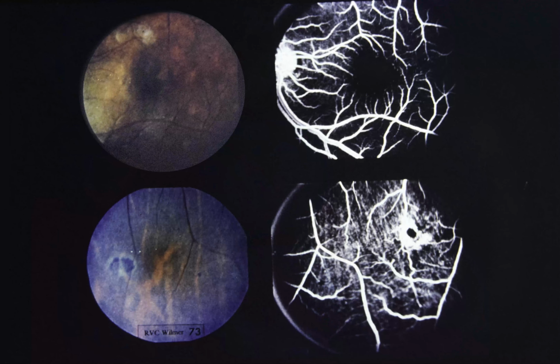Slide 73. Hemoglobin SS and retinal infarction. This 34-year-old black female noted a sudden decrease in vision. Visual acuity left eye was 20/70. Upper left, note loss of foveal reflex and subtle macular edema, left eye. Upper right, note multiple occlusions of macular arterioles surrounding retinal avascular zone, which is at least twice normal size.